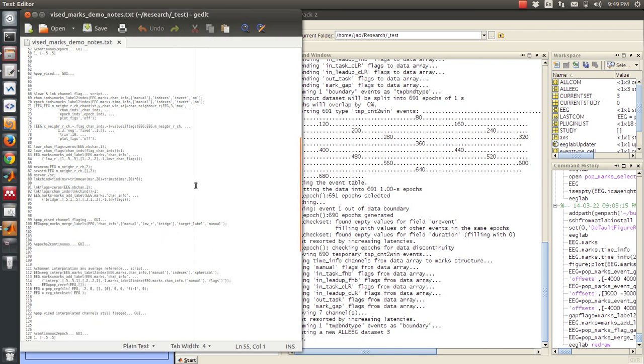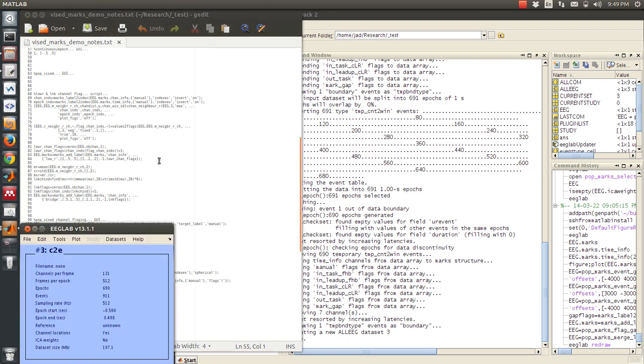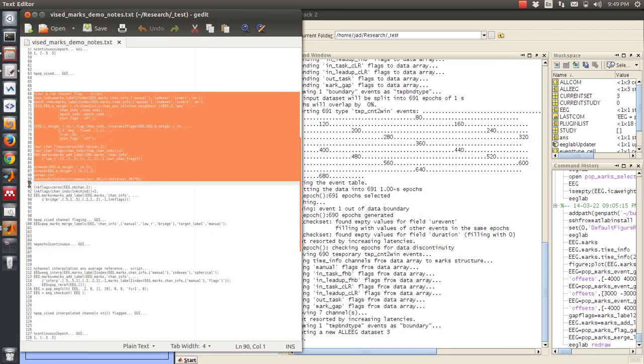Now, what we can look at here is actually we can use some code. Although this extension is built to make it easier to interact with the data, it also makes it easier for testing new methods for flagging artifacts or capturing data, and then visualizing how that works.